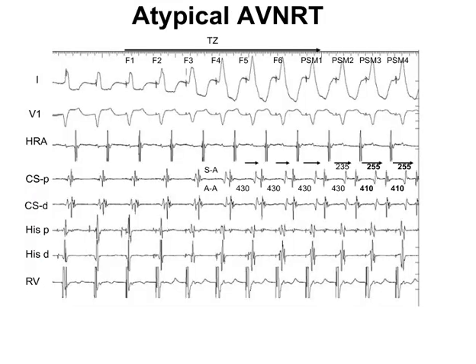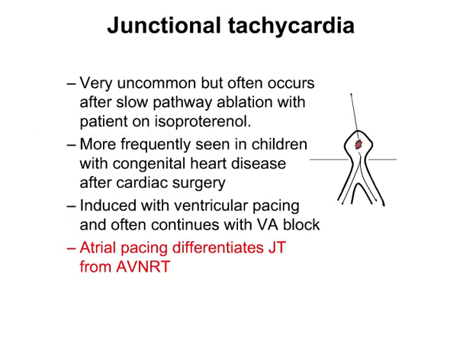For AVNRT here, we see that you have to get to a stable, wide, complex paced beat before you start to affect the tachycardia. So it's got to get retrograde through the AV node first. Got to take over activation completely in the ventricle.